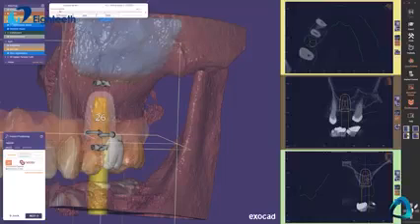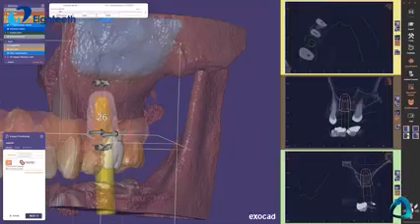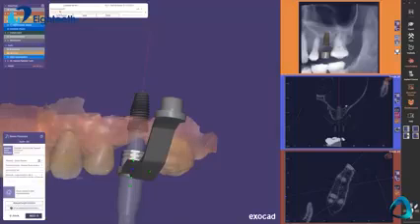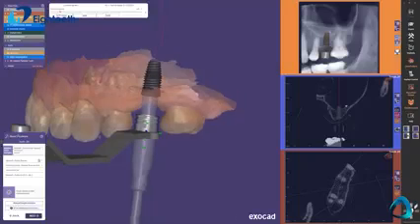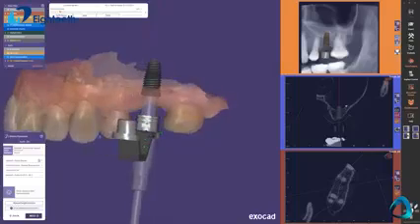You can place your implant anywhere in 3 dimensions using the CBCT and scan data to help guide your digital implant placement. The key is to respect all the anatomical features and to ensure that the implant position will facilitate a successful restoration. From here, we carry out sleeve placement of the implant sleeve. This can vary based on your implant of choice, but a metal sleeve is typically placed into your printed or milled guide. This is purchased separately, and a digital sleeve file is shown here.